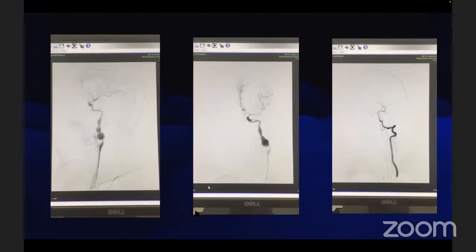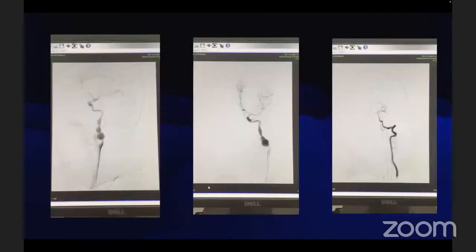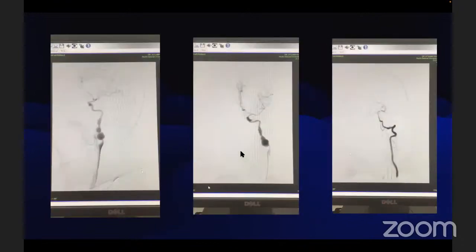I think it's a dissection only, and there is a pseudolumen. When I went through the literature, both dissection and fibromuscular dysplasia start beyond the carotid bulb, sir. The irregularities of the wall and lumen are both there in the same region, but the only odd point towards non-dissection is fibromuscular dysplasia having aneurysms, like the protrusion on the left side.